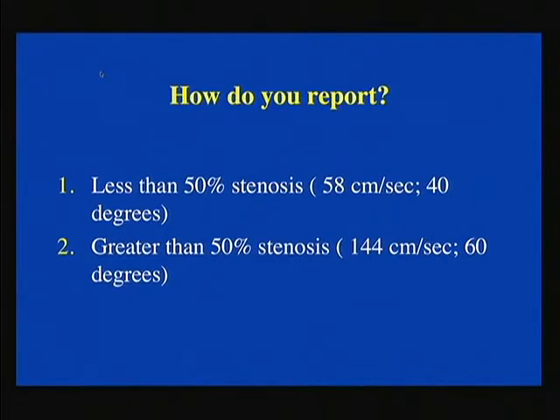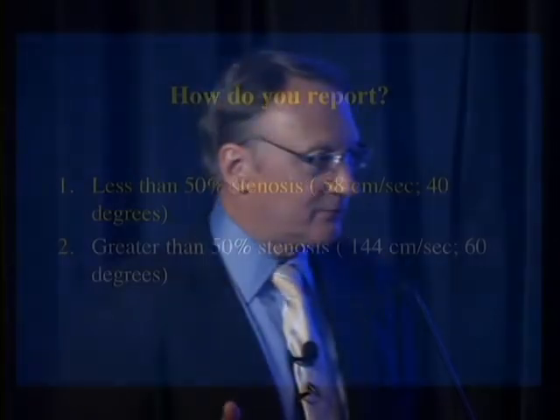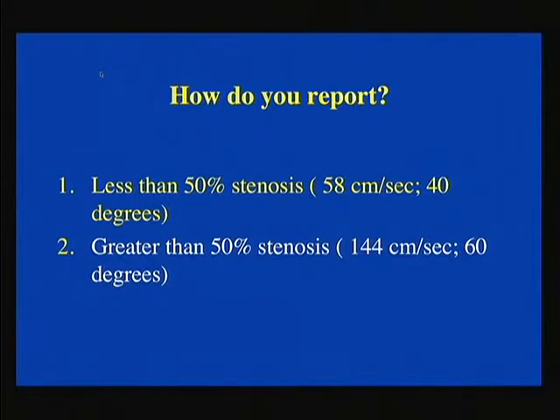So which one would you use? Now, I will show you the correct answer. And I want you to think, because a third of you will have picked the one you're not supposed to pick. As we've seen that. The correct interpretation is the less than 50% stenosis with the angle correction aligned parallel to the direction of blood flow, and that was the 40-degree one. That's the correct one. It's lined up properly in the direction of flow. Because I use that word 60 degrees, a lot of people still get fixated on that's better, even if it's completely incorrectly positioned in the lumen of this one case.